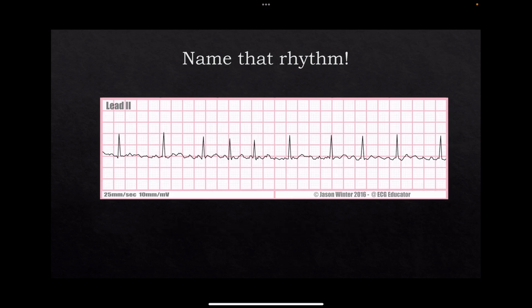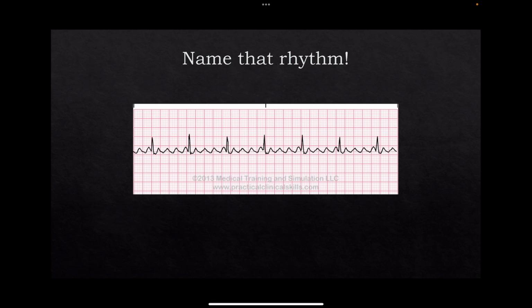Okay. Do your rate, rhythm, what's going on here? Why is it AFib? A lot of squigglies and yeah. First of all, are the QRSs normal? Are they marched out regular? No, they're not. Can you even see P waves? Not really. Okay, atrial fibrillation. What is this one? A flutter, your sawtooth pattern. Normal rates for A flutter are around 150, but the atrial rate is like 300, 400, because only some get through. Here's your A flutter.